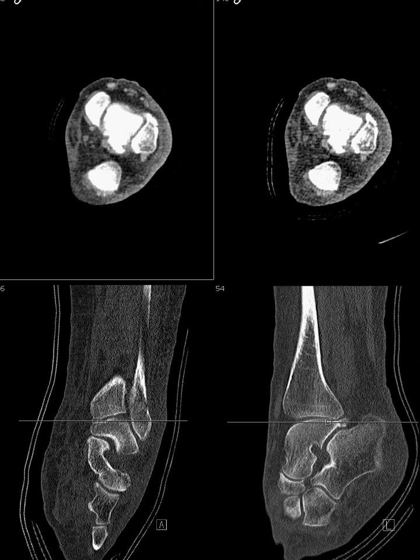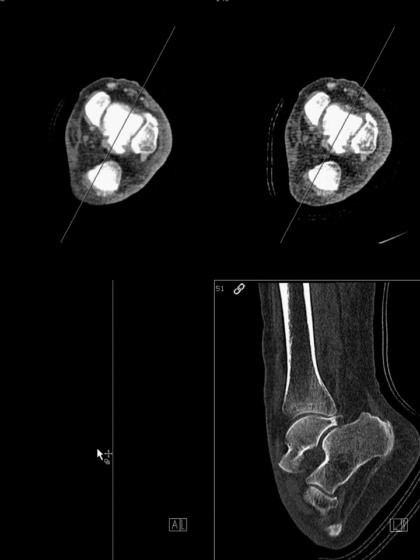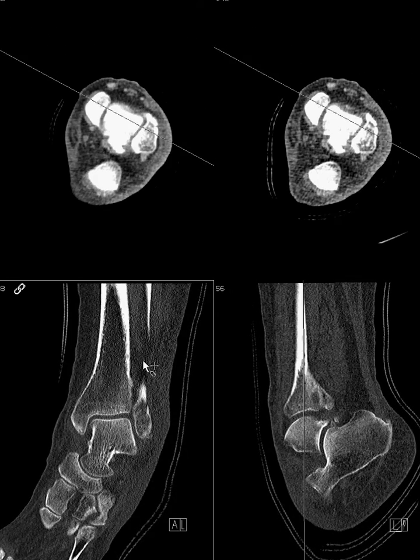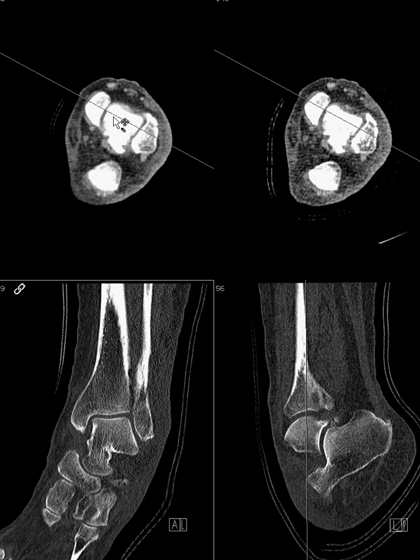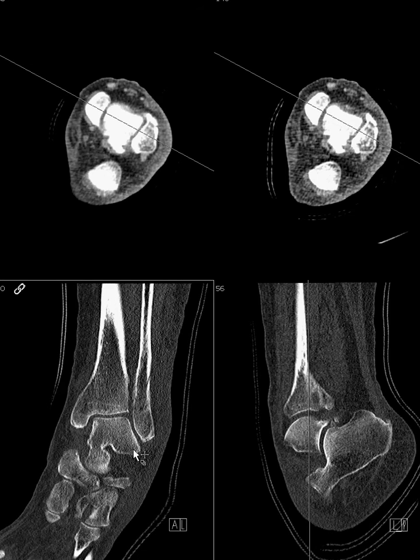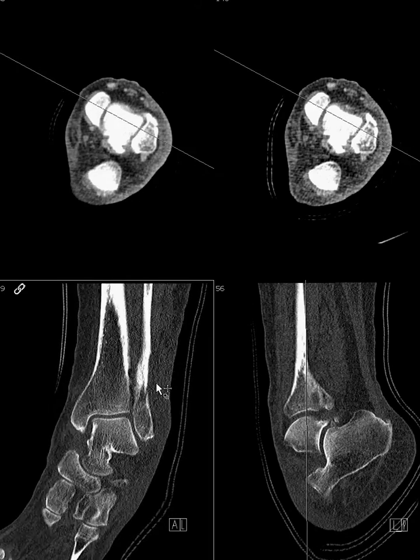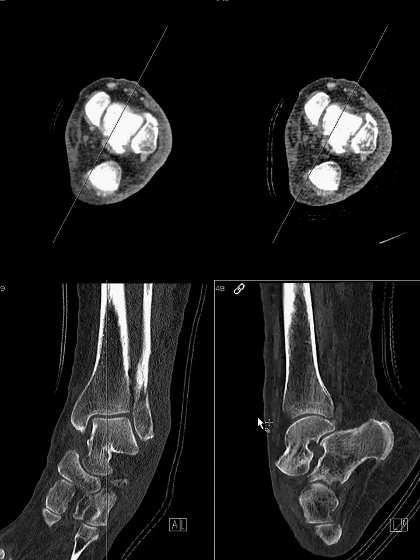let's see here, this, and you can see that these coronal images are now done basically close to the axis of the malleoli. I would have probably made it slightly more oblique like this, but you can see how the ankle looks. You can see the whole, what we call the ankle mortise nicely. It's like an oblique frontal ankle radiograph. And then the sagittal images are perpendicular to that line. Okay, and that's how you do ankle reformats.